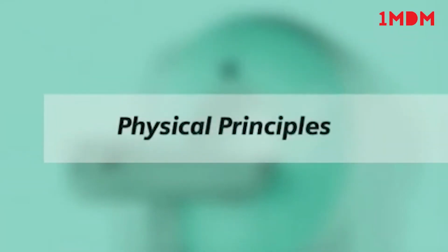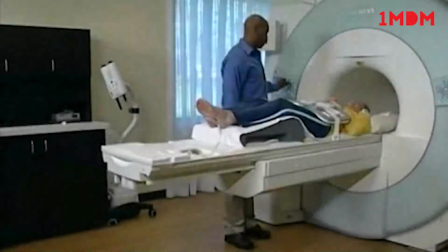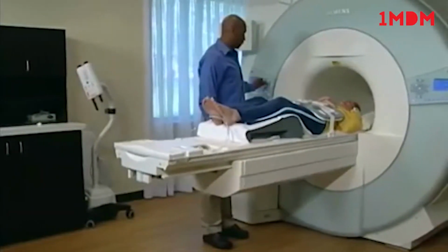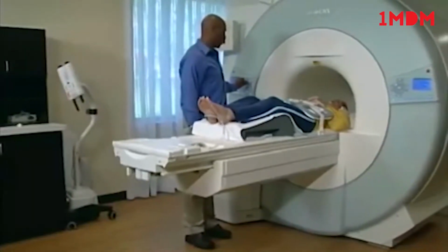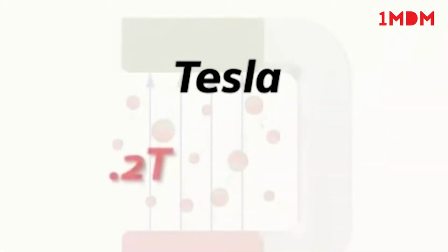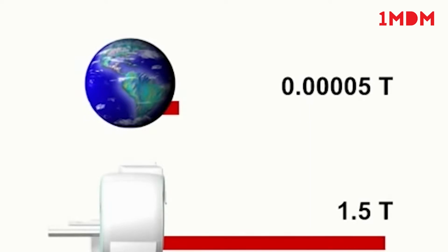Physical principles. The patient is positioned in a powerful, homogeneous static magnetic field generated here by a cylindrical magnet. The strength of the magnetic field is indicated in units of Tesla. The Tesla strength for human imaging ranges between 0.2 T and 3 T. In comparison, the Earth's magnetic field is approximately 0.00005 T. The static main magnetic field of a 1.5 T magnet is approximately 30,000 times stronger than the Earth's magnetic field.